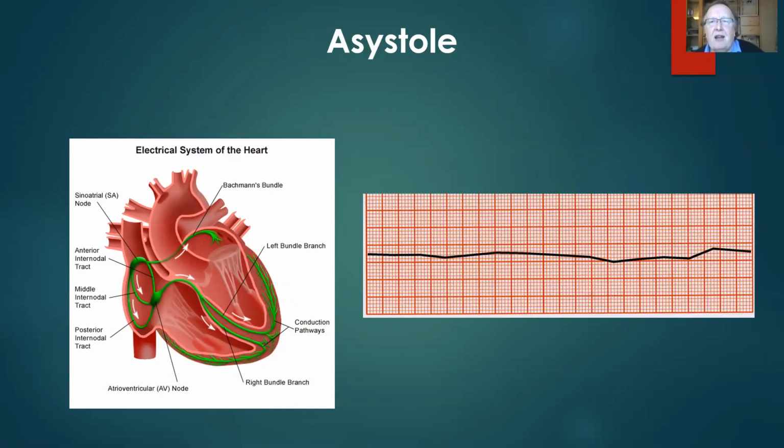Asystole, the flat line. A before anything means none. Systole is the contraction of the heart. First question is the patient breathing? Do they have a pulse? Check the leads and make sure your mate hasn't cut through one of the leads when you've been wiring the patient up. And obviously, a flat line is going to get CPR'd. Next slide, please.